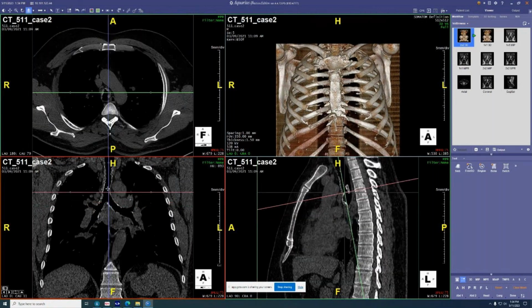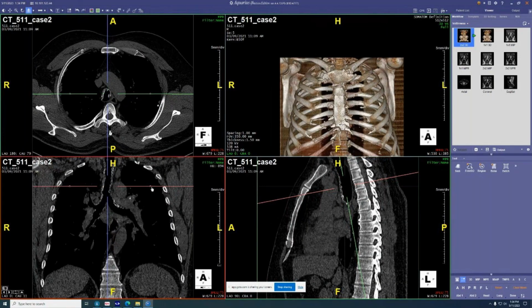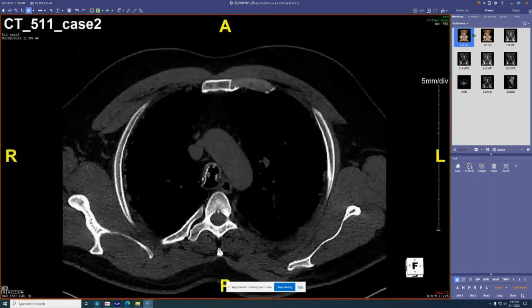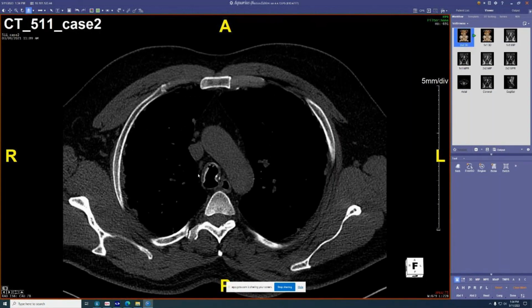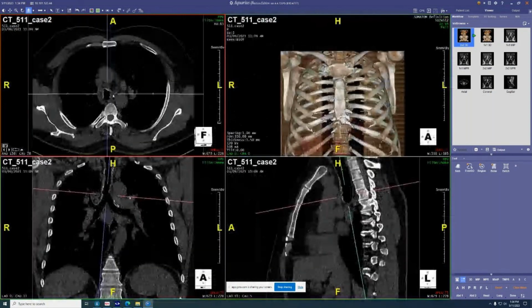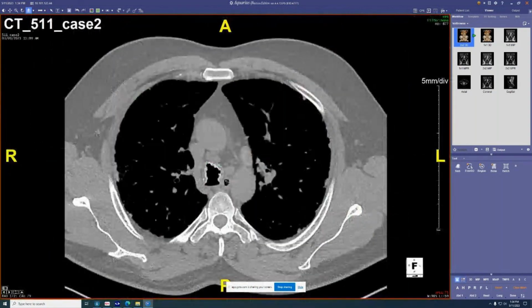So really the differential is relapsing polychondritis, but usually we like to see a little more stenosis, and usually it's not as nodular-ish like this. And what this is, which they confirmed on path, was tracheobronchopathy osteochondroplastica. So they actually biopsied it. Yeah. That is the most exuberant case I've seen, because usually we just see these tiny little bumps.